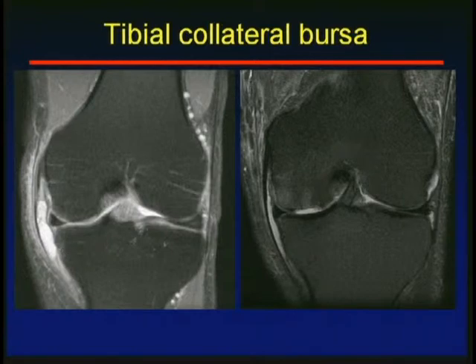And when you have the bursa, the distinction between the superficial and the deep layers becomes easier. So we can see the superficial medial collateral ligament bowed, and the deep components represented by the meniscofemoral and the meniscotibial ligaments are much easier to identify.